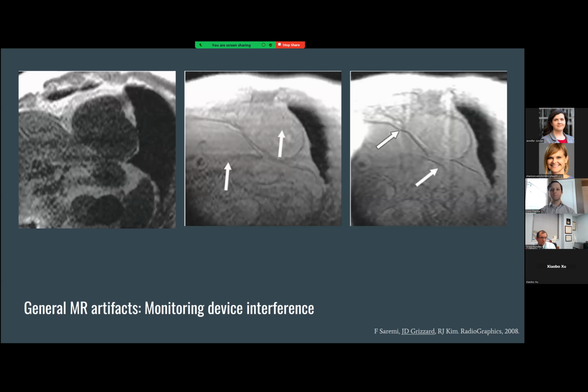On the left-hand side, we have our perfusion image in a trial acquisition before we have the contrast on board. And what you may appreciate is there are some horizontal lines that come across the image, and that's our phase encoding direction.